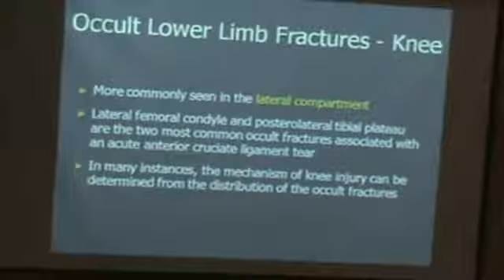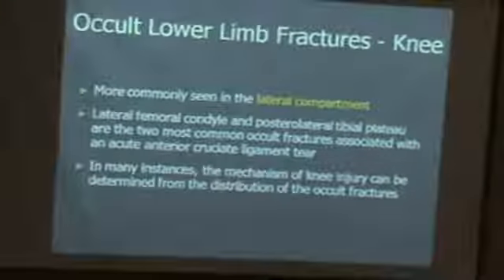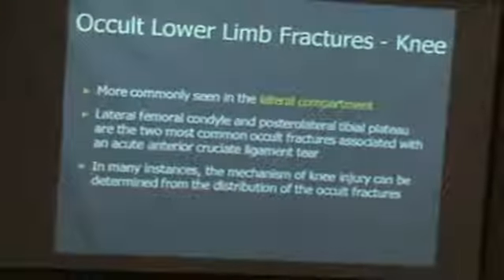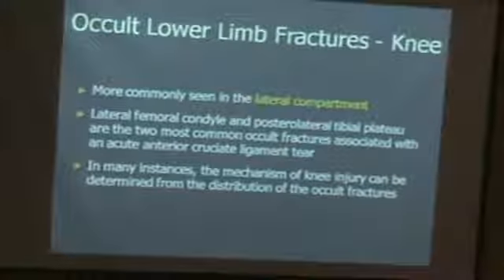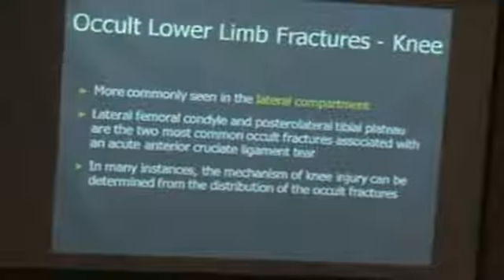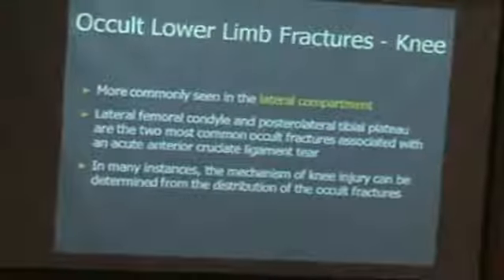But you don't look at the T1 weighted. We acquire the T1 weighted and I don't look at it at all myself, to be honest. But I look at the T1 weighted now when I have a suspicion of bone marrow infiltration, or a high suspicion of fracture. I look at it to make sure that there is that thin line we talk about, which is the fracture.